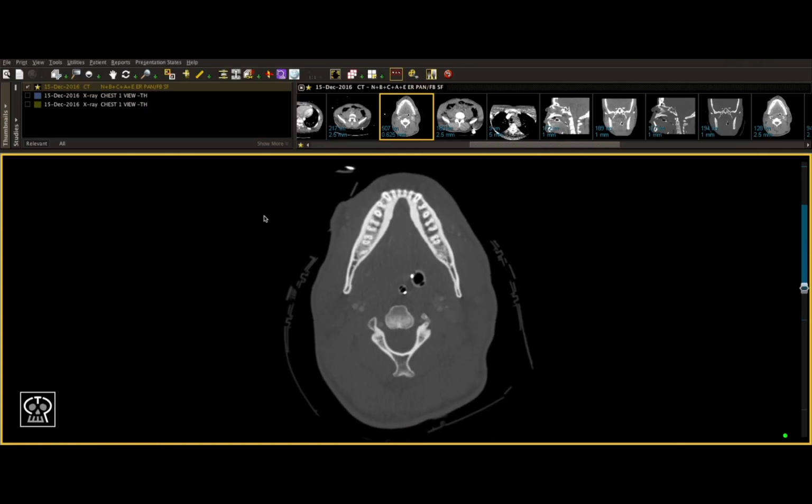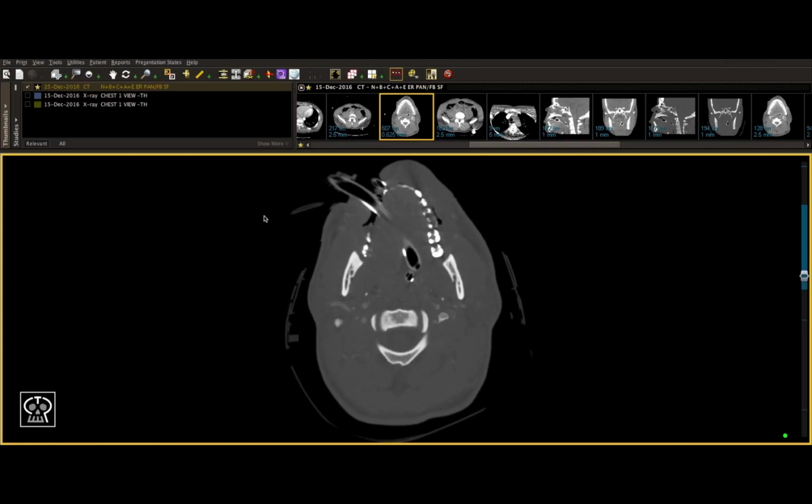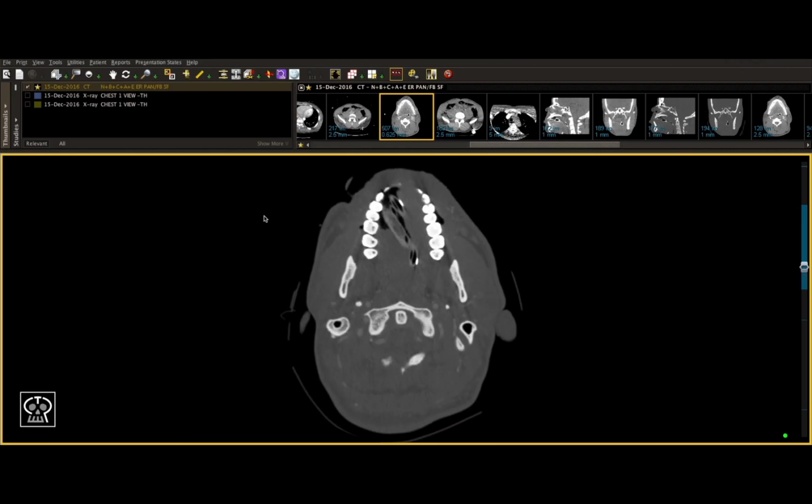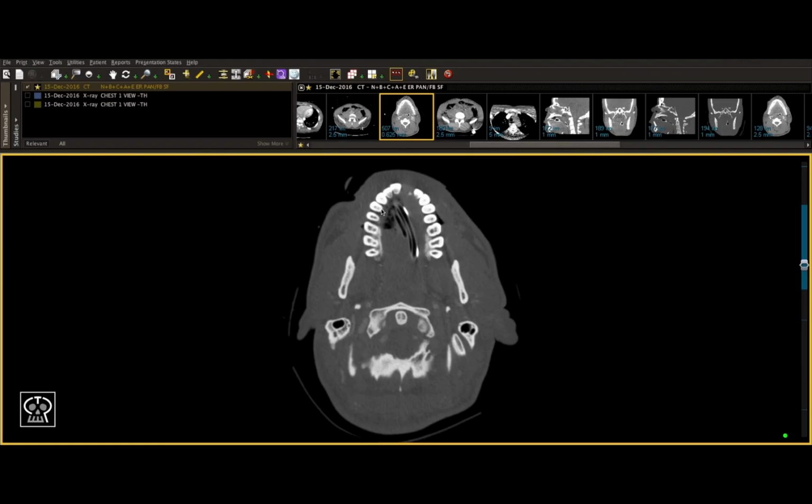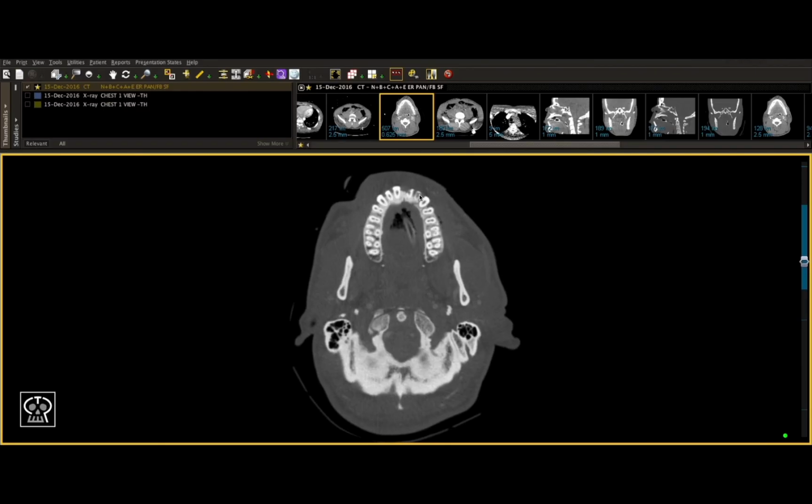In this particular example, starting off with the maxilla, as it comes into view, right away you notice something when it comes to the anterior teeth. There seems to be a line going through this tooth, which would be 2-2. This is our midline, so this would be 2-1 and then 2-2, or our left upper lateral incisor. And in addition, with 2-1, the shape doesn't seem to be symmetrical. There seems to be something missing or fractured here as well.